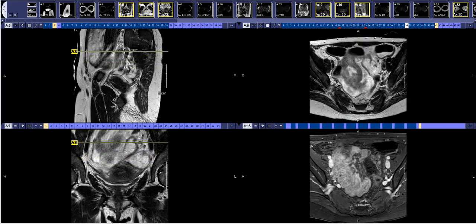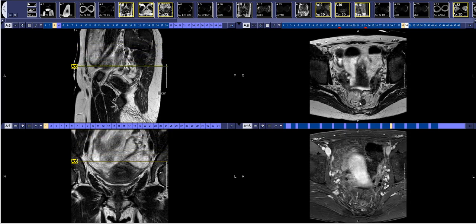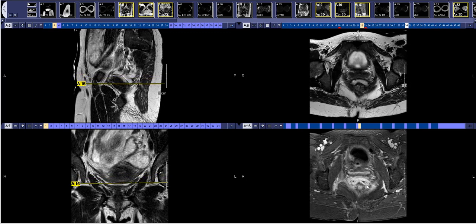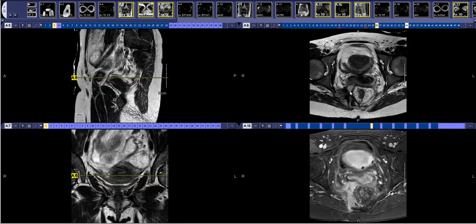This final case here is just to show you a more complex fistula. So this patient has some ascites. As you follow the rectum down, there's a larger fluid collection here. You can see it's enhancing around there. There's some non-enhancing stuff in the middle. That's just complex. So this is an abscess here surrounding the lower rectum and the anus.